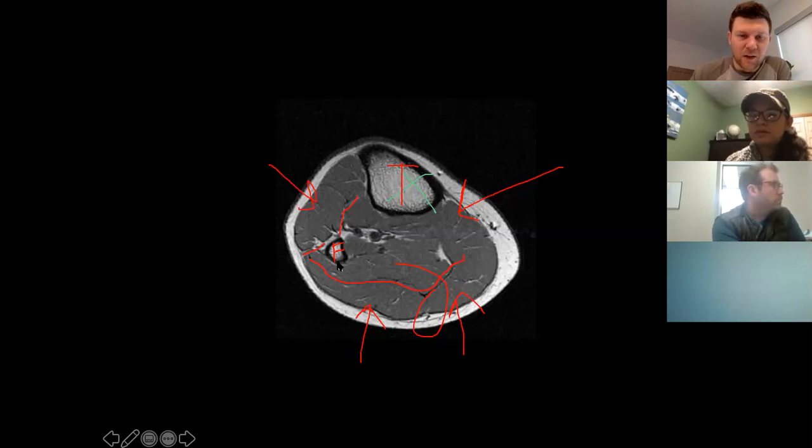Anterior compartment, good. You're going to have some lateral coming off the fibula, which would only be one muscle. What would be the muscle coming up off the fibula that high? Peroneus longus, good. And then all in here is going to be your deep posterior compartment. Remember from the lab when Dr. Clardy grabbed the one that's the most lateral? This one was your FHL. Good.